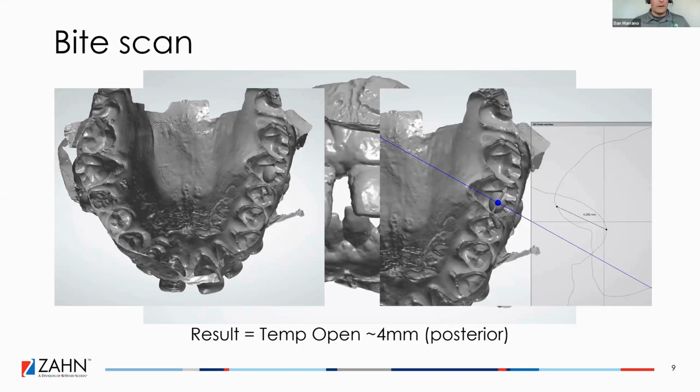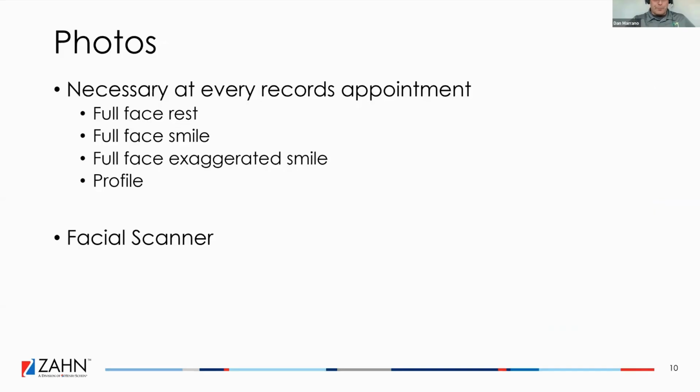All my bites are going to be perfect. That's certainly what the salespeople tell you. Try to talk to your doctors and the assistants about looking at the scans before they send them, because so often we get these, we most often see one side is poking through the other side way too far. So keep an eye and review these before you dive into your design.